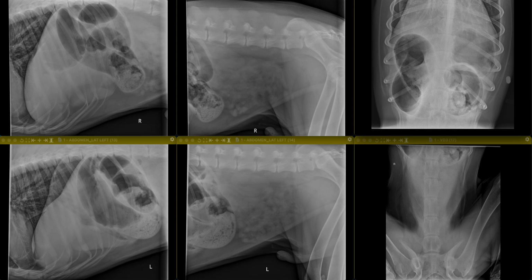Our conclusions for this patient are segmental and consistent colonic distension with suspected abnormal positioning of the cecum. Primary consideration is given to colonic malpositioning, specifically torsion, or vascular compromise, such as entrapment. We have to consider the potential for concurrent gastric mural change or gastritis, and there is suspected hypovolemia.